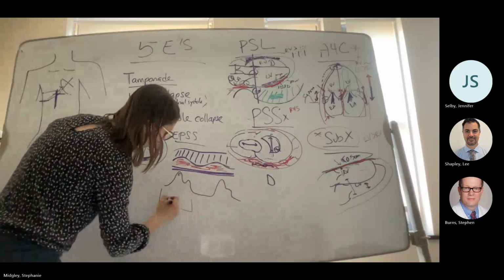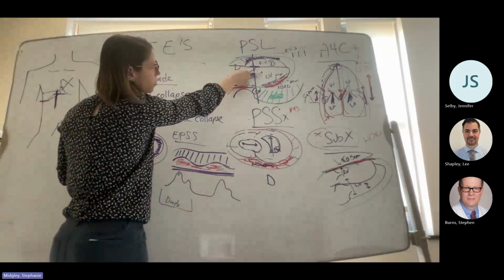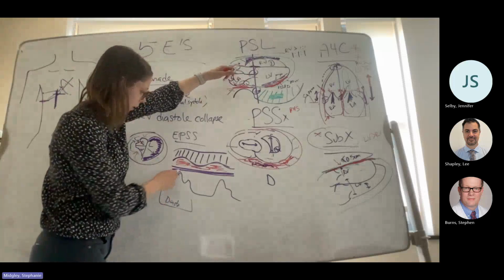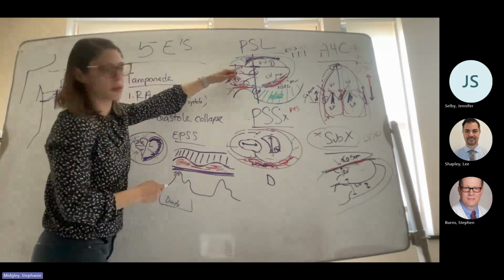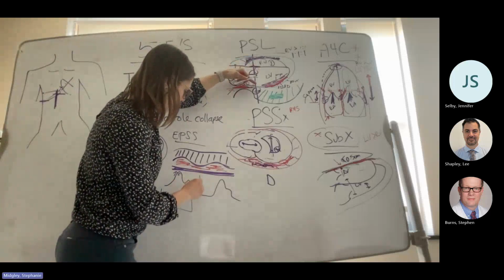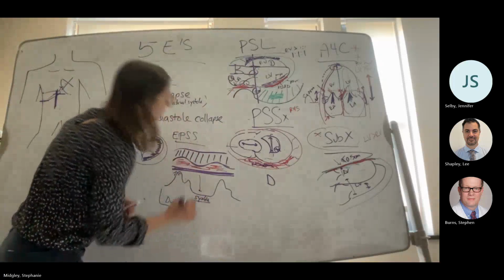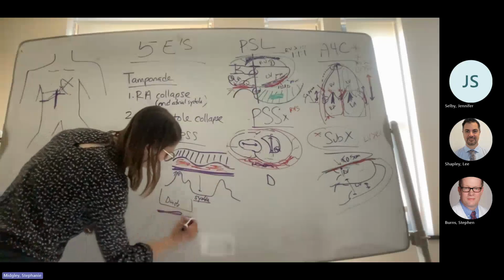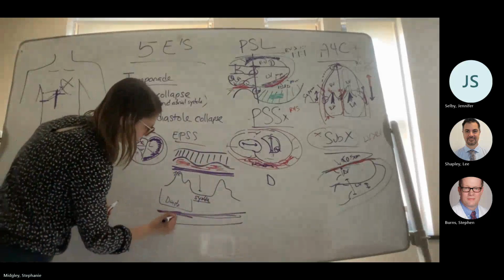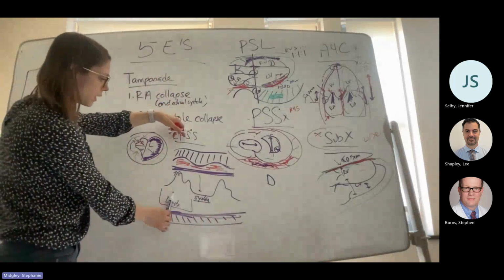So this is diastole. I know it's diastole because my valve is moving towards my septum. So my valve opens towards my septum. Here's my septum, here's my valve. I'm in diastole. Does that make sense? And then when my valve closes, it moves away from my septum. And this is systole. And then you'll see the back wall of my LV, and then you'll see that posterior effusion. So now in this view, I can figure out when's diastole and when's systole.